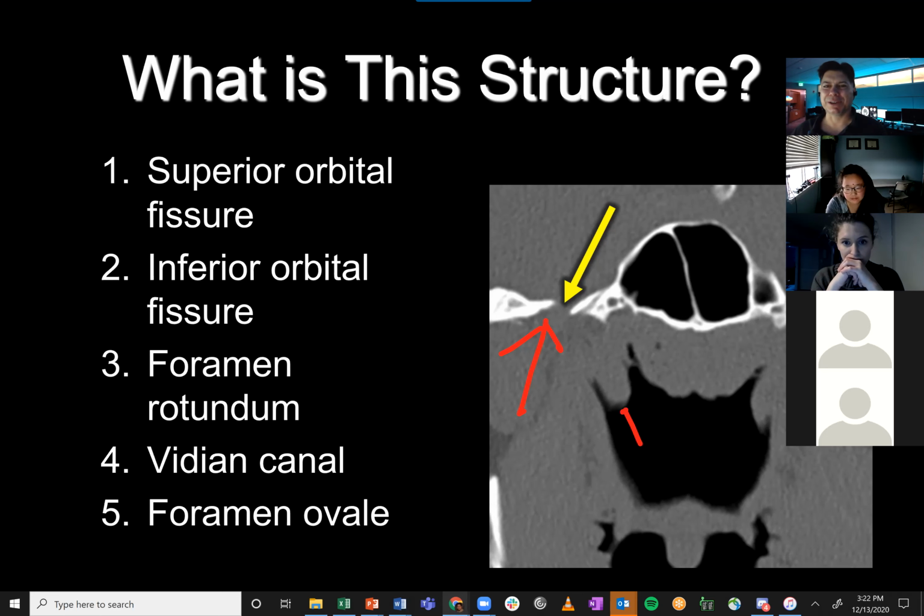Yeah. What is that guy? Is that the eustachian tube? Well, no, the eustachian tube is this opening behind it. But what is the bump in front of the eustachian tube? The torus tubarius, that bump in front of it, that's right. And the lateral pharyngeal recess we think about is behind that. The bottom of the lateral pharyngeal recess is where nasopharyngeal carcinomas arise. So when we see that torus tubarius, that bump, we know we're at the level of the nasopharynx. That's right. So that is ovale.